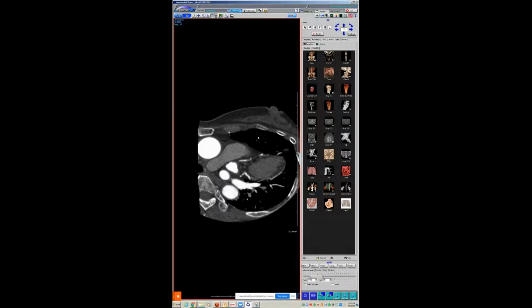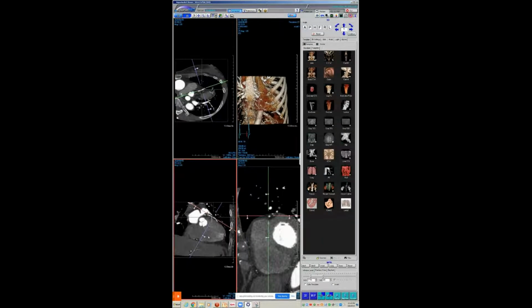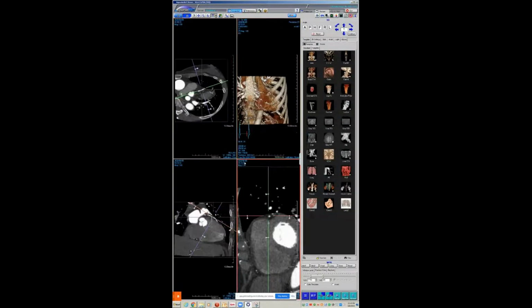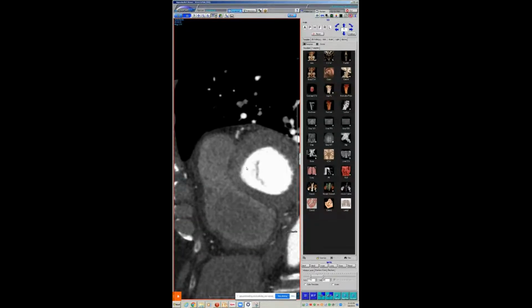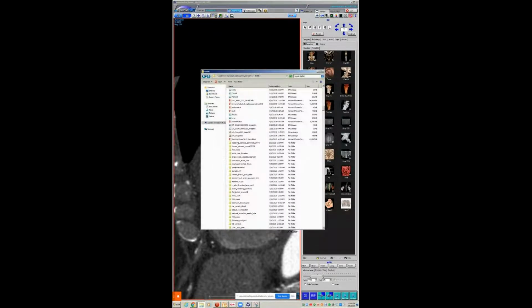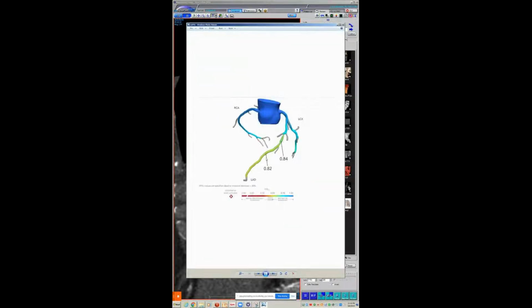So she had chest pain, and I had a younger resident on, and I'm like, oh, let's, you know, this is a Medicare patient. I don't even know why I sent it to HeartFlow, because really I didn't even think it was indicated. Oh, I did. No, the reason I did is because she had actually looked up and she had an equivocal stress test. So we went ahead and got the HeartFlow, and shockingly, I mean, this is her CT-FFR.